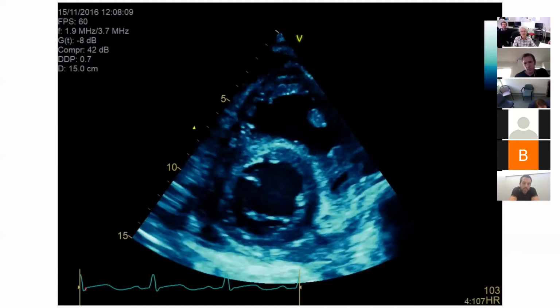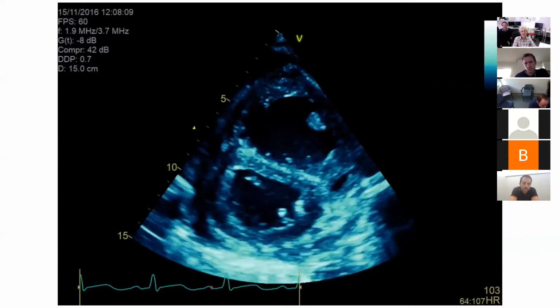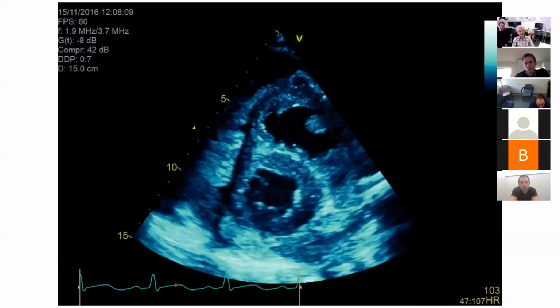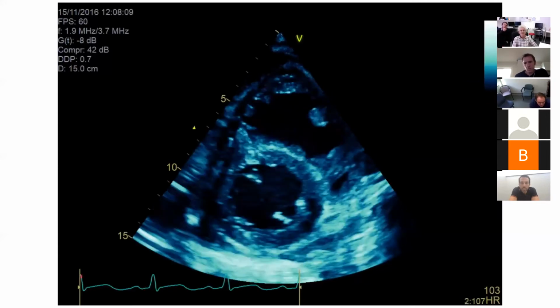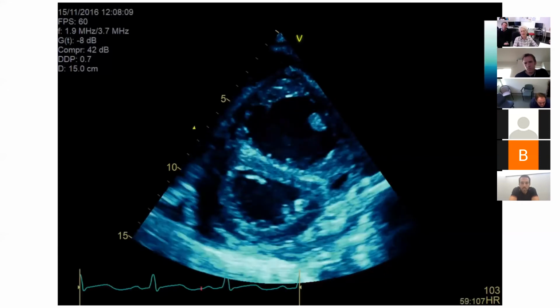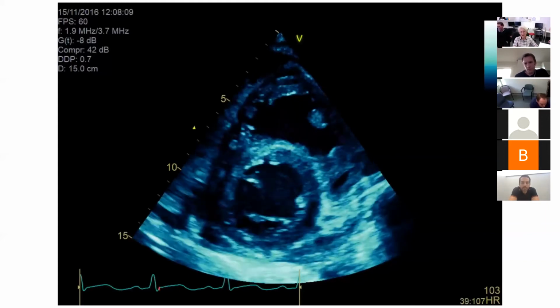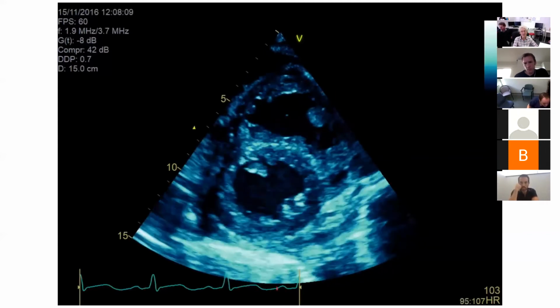And if there wasn't a papillary muscle in the right ventricle, what else could it be? Well, clot, vegetation. Before that? The clot or the vegetation, absolutely, but I think it is sort of moving with that wall. It's moving in and out. It's more likely to be a moderator band. Nice, yeah, a normal feature, the moderator band that's in there. Okay, moving on. Remember his history though, that he had a massive PE on his previous hospital admission.